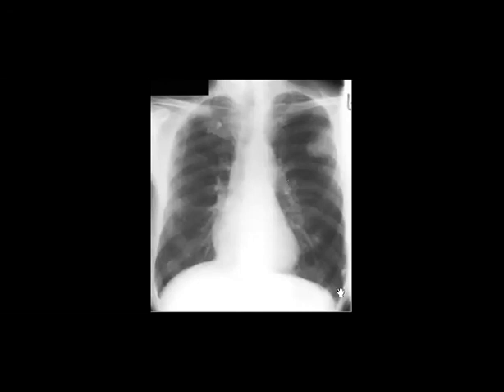They mention also that there is maybe a fracture here, or old fracture. Maybe you can consider it like an old fracture. Okay, so what do you think about it? What is the differential diagnosis? I see Nermeen mentioned metastasis and enchondroma, it can be a good differential, nice. So metastasis, for example, lytic metastasis, it could be renal cell, breast, bronchial, thyroid, the common lytic metastases, and fibrous dysplasia is good, nice Nermeen.